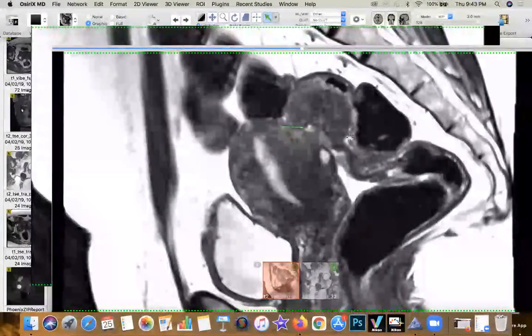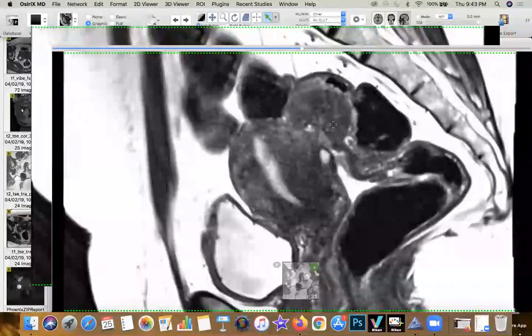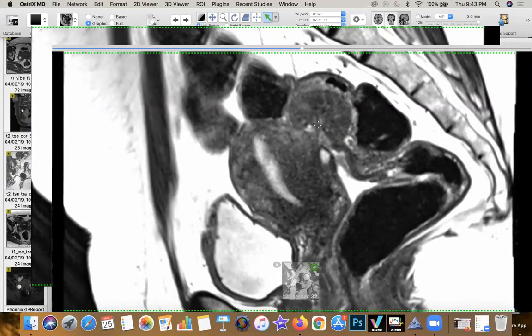It kind of puckers it. And as it starts infiltrating, the muscle starts to hypertrophy and show also a desmoplastic reaction. And it produces the so-called mushroom, where you have a cloud-like appearance with the core, the point where it has actually infiltrated, puckering completely. So this mushroom head with a narrow stalk is a classic imaging feature of full thickness invasion of the rectal wall itself.